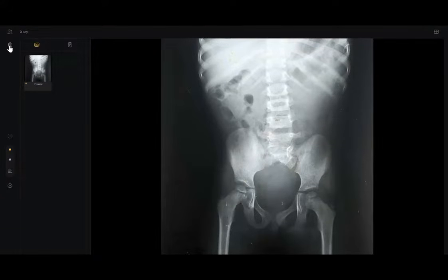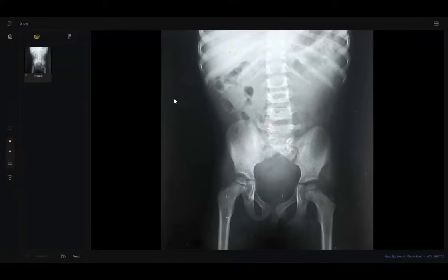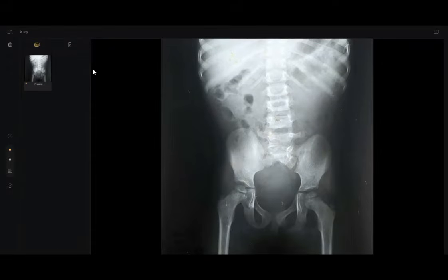Yes. This is a 12-year-old female with lower limb paresthesia. I've been provided with the X-ray of the abdomen and pelvis of a young child. There appears to be a defect in the posterior elements of the sacral vertebrae, most likely suggesting spina bifida or meningocele posteriorly.